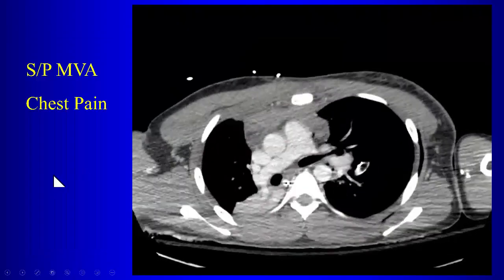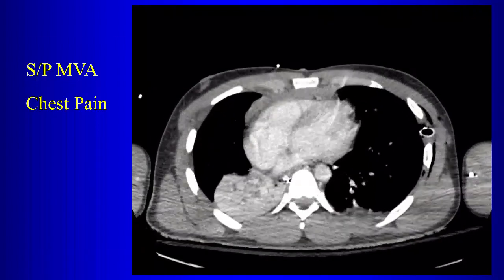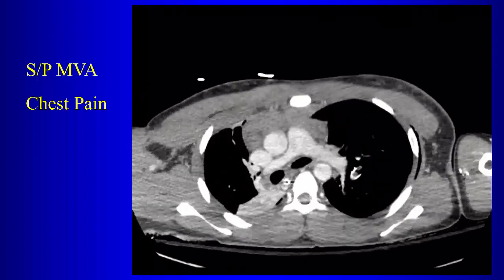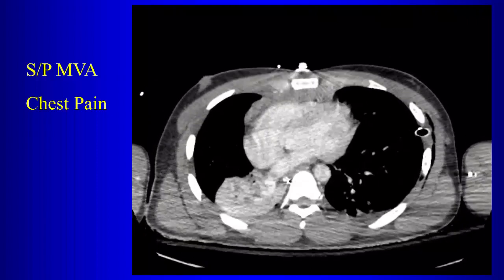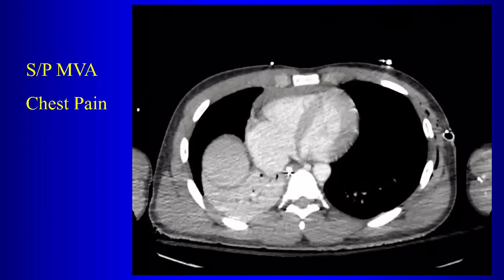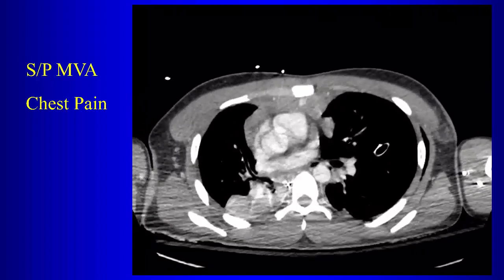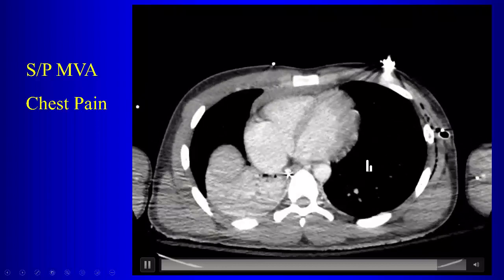Another patient with chest pain. So first question, is there hematoma? Yes. It's in the anterior mediastinum. And is there anything else? Yeah. So, of course, whenever there's hematoma, you want to look very carefully for any active bleeding, right? Are there collections of contrast where they don't belong?